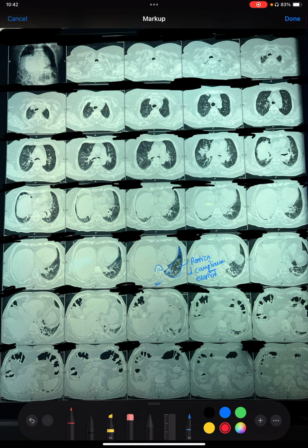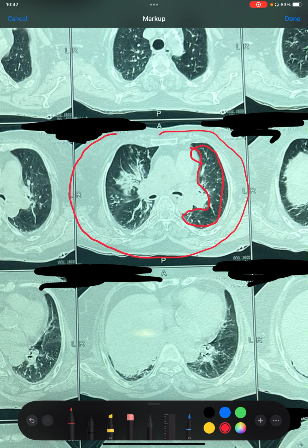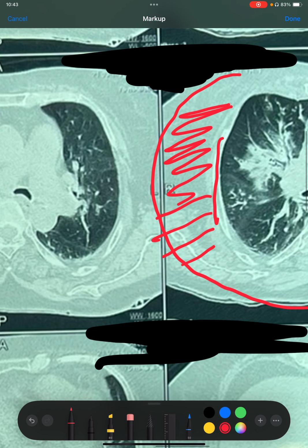Just see that in this image, the lung area is so small. In the first image, we could see a significant amount of lung, but here, see, this is all fat. This is the rib, and this is the outer portion of the rib. See, this is very clear cut. This is rib. This is rib. You can see here. This is a rib.